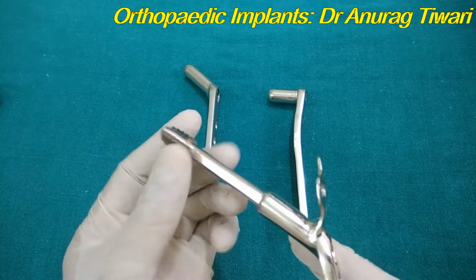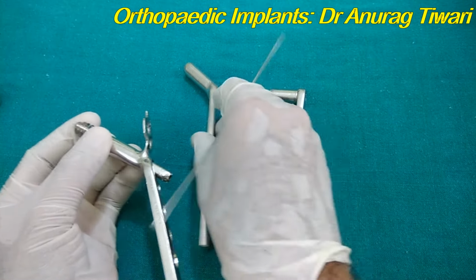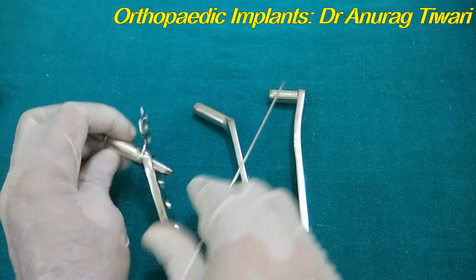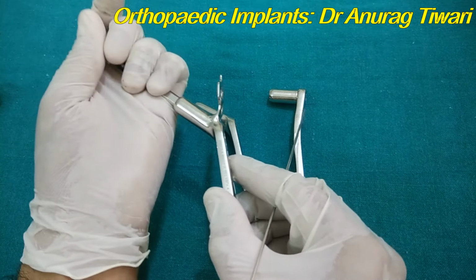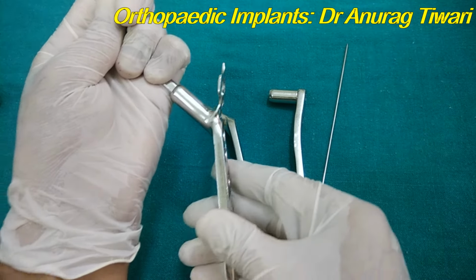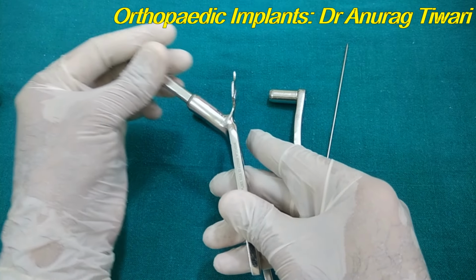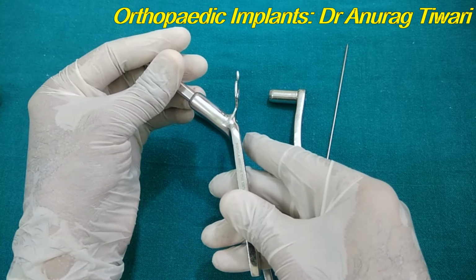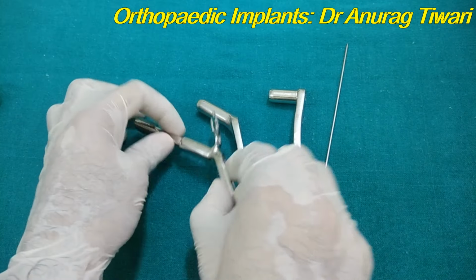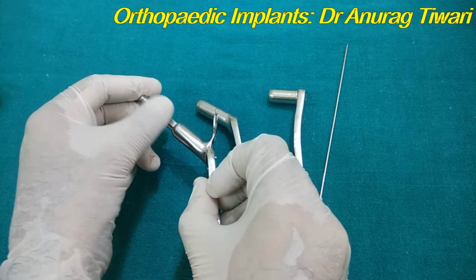So this is actually the lag screw or the Richards screw. This will go in this barrel. You can see that the barrel has the cannulation. So the screw will get fixed over the head and the neck of the femur, and the plate is going to be fixed in the shaft of the femur. When you fix this and this, there is a play between the two, and this is the main principle, because now the fracture will collapse in a controlled way. So we can control this collapse or compression, and this is known as controlled cancellous collapse.